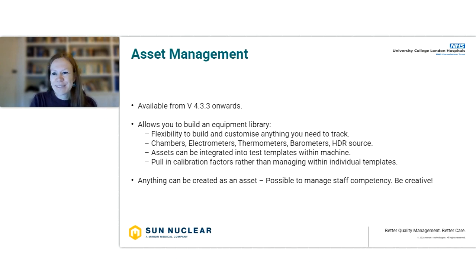But now we have this wonderful new feature, well, not so new anymore, called asset management. And it really allows you to build an entire equipment library within SunCHECK. So you can build and customize anything you want to track in this module. So we use it for chambers, electrometers, thermometers, barometers, and our HDR source, but you could use it for anything that you have. And then those assets can be pulled into the machine templates, and any data associated with them can be used within your calculations.